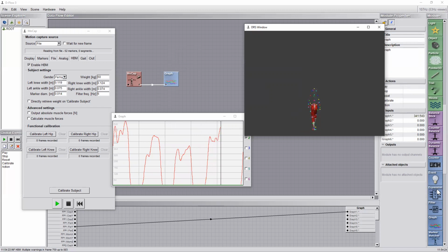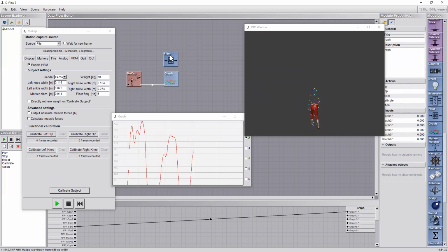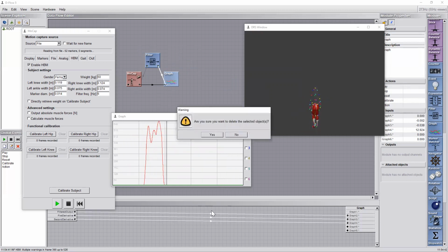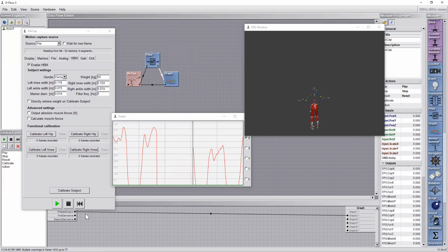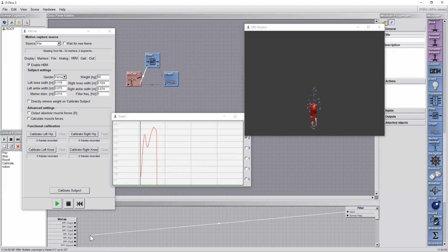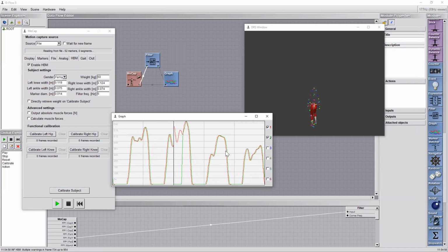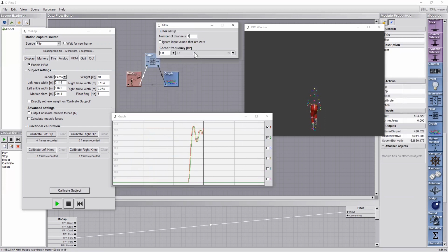For instance, here, for filtration, we've got a module here. I think I saw this module here, filtration. So what we want to do is first filter the same signal and then come back to the graph. Okay, and I'll just delete everything and then go for the output, the second channel, and then go for this part which comes from the same force plate, right? So that's why you can see the same signals, but a little bit of difference in terms of filtration. And as we showed before, you can manipulate it here with the signal, okay?